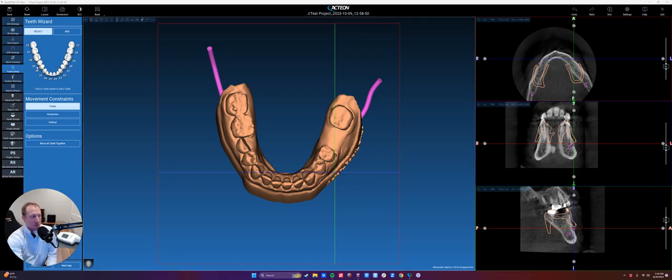And notice the odontogram up here on the upper left is showcasing number 17 to 32, or the lower teeth. And that's because in the CPR settings, we chose mandible. Had we chosen maxilla, those numbers would be 1 to 16. So in this wizard, we have a couple different options.